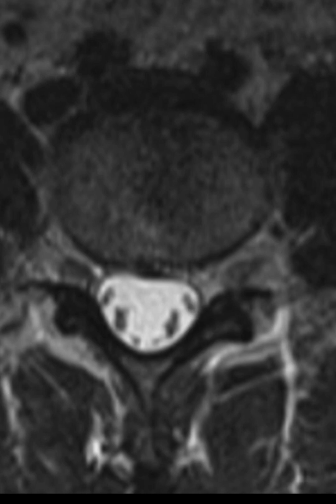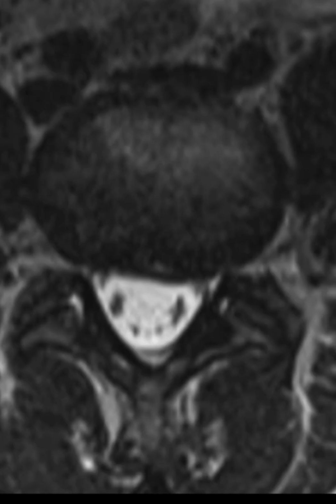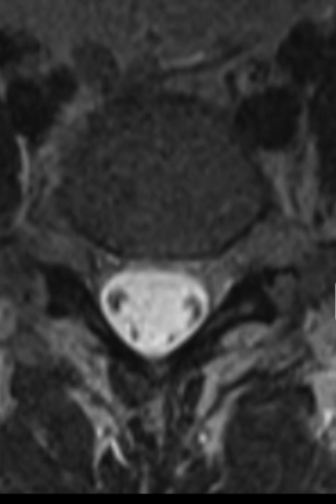So I'm going to scoot down just one more segment. You can see right about there, this disc here is starting to touch the nerves, and it kind of crowds it. And this is actually the descending L5 nerve root on the left side. This is on the right. So as I went down just one more cut, now you can really see that the disc is starting to touch the nerve roots, and nerve roots do not like to get touched.